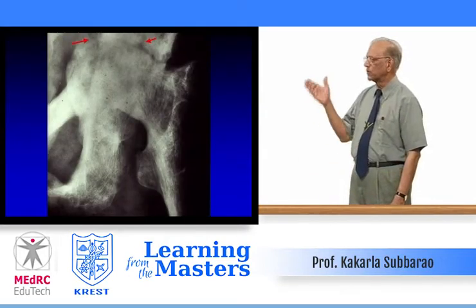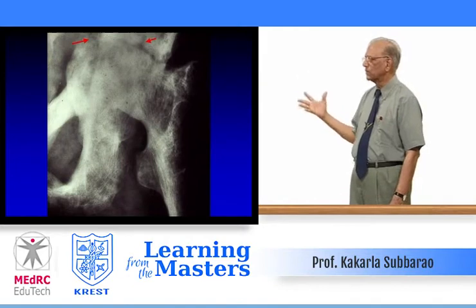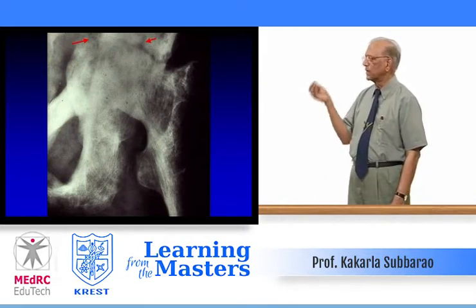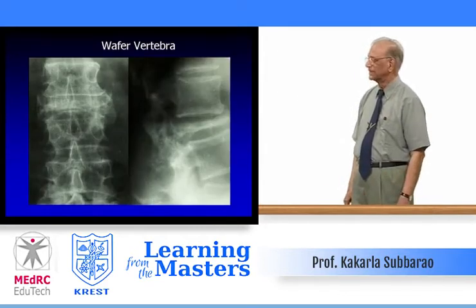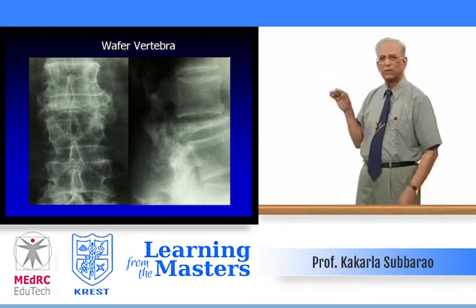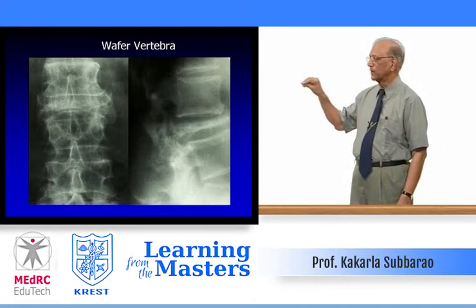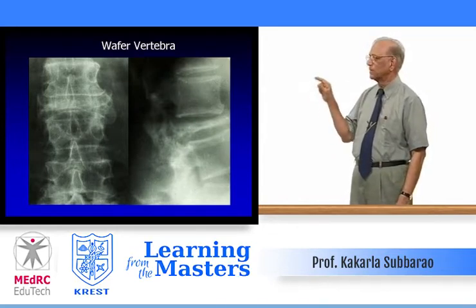And then protrusio acetabuli with multiple fractures of the acetabulum. Not one, two or three fractures. The diffusely involved mixed type of pagetoid process, both in the pelvic bones as well as the proximal end of the femur. Wafer type of vertebrae, what is it? A markedly compressed vertebra, almost a vertebra plana, a flat type of vertebra you can see in Paget disease.